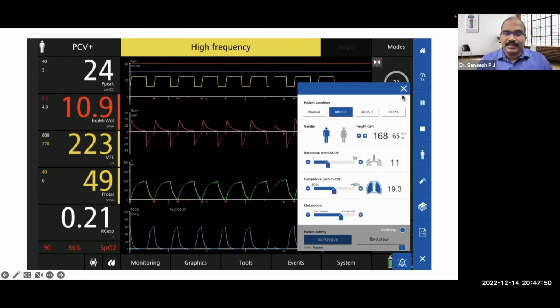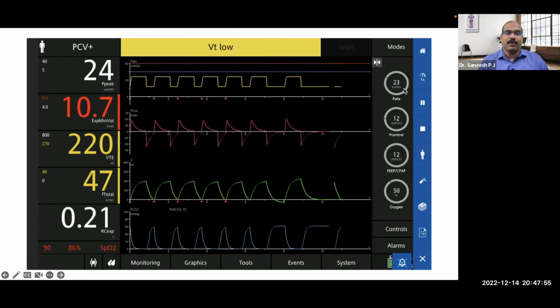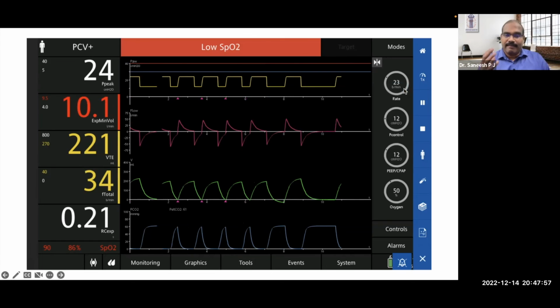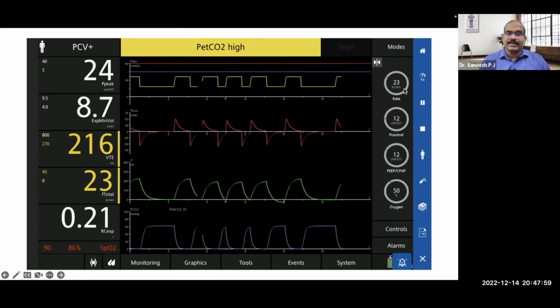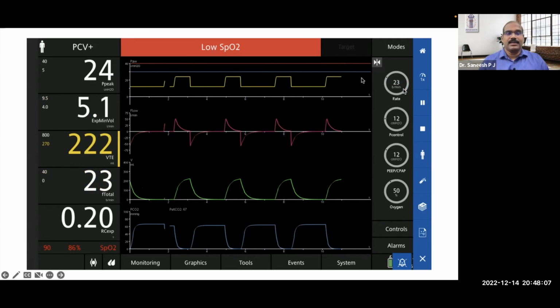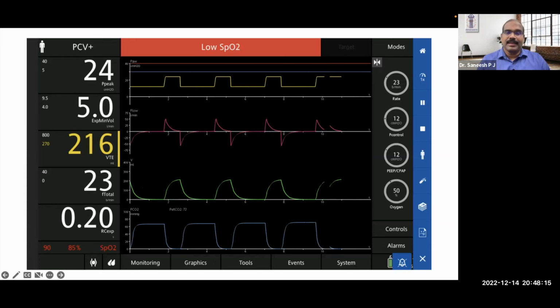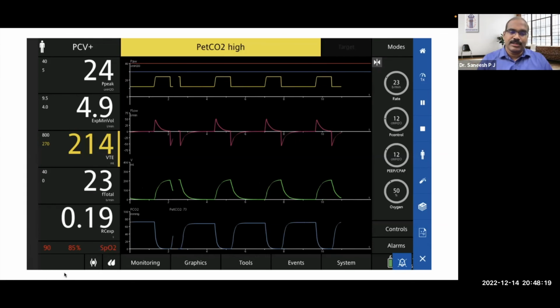That is the importance of knowing scalars and loops, or becoming more familiar with the rapid clues our modern ventilators give you in the bedside scenario. Pick up the clues, be familiar with the solutions, get a handful of solutions with you when you go to the bedside, and interpret scalars and loops more meaningfully. Every day is a learning opportunity. Make use of it. Wish you good luck.